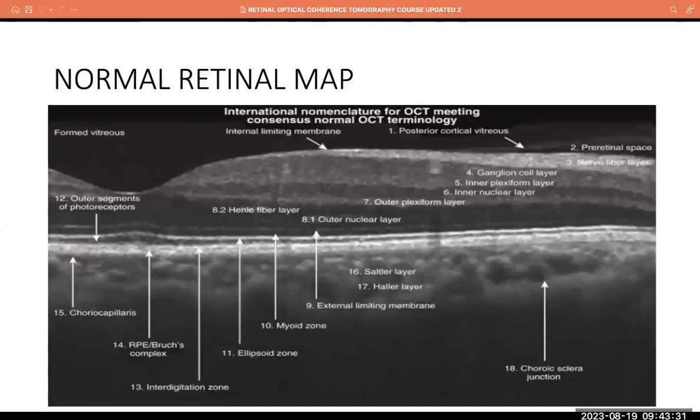That's because when you have the OCT in front of you and the eye of the patient is covered from you, look for the part of the OCT that has the thicker nerve fiber layer depiction. If the OCT was taken centrally, the thicker nerve fiber layer depiction points to the eye. So in this OCT right in front here, Dr. Baturi, you can put your cursor on the nerve fiber layer. In this OCT here now, the nerve fiber layer is thick to the right. So this is the right eye.